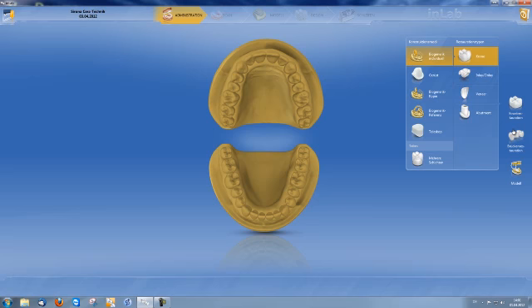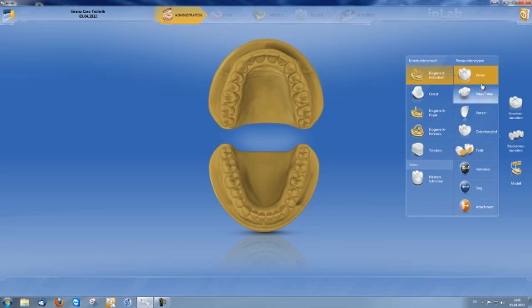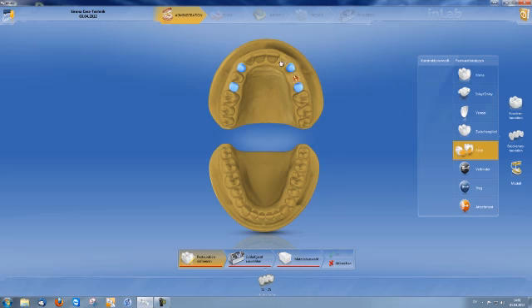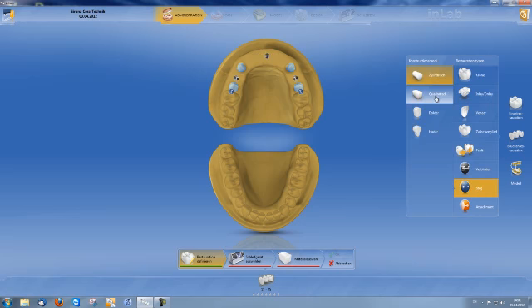For this, I click on Bridge Restoration, Crown, Telescope to firstly define my preparation. I then enter the missing teeth, followed by the bar type. To this end, I click on the connector symbols. We now have a closed restoration.